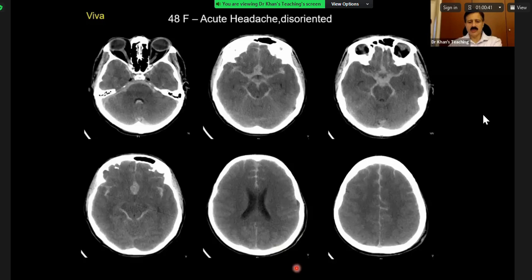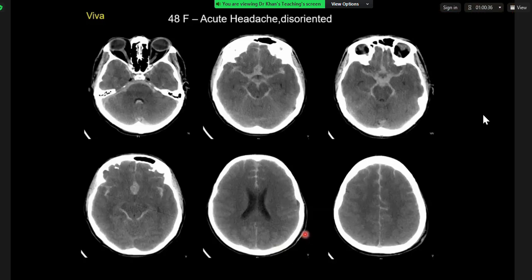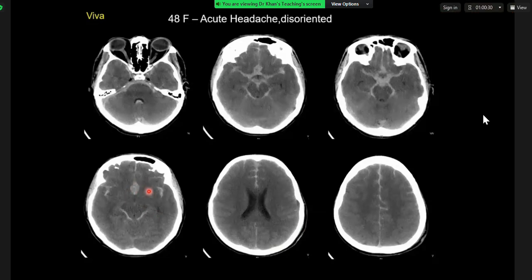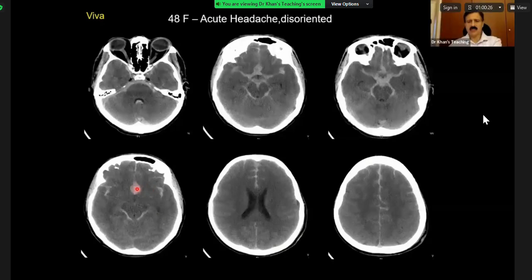So anatomy-wise, where is this aneurysm sitting? So this will be in the basilar tip. This is not, you see, this is the territory of ACOM. Yeah, apologies. Yeah. ACOM, right? This is a classical exam case, and they will ask you, what is the cause? When there is a thrombus sitting at this, you just say that this is in keeping with ACOM. Of course, you would like to confirm it. That's a second thing.